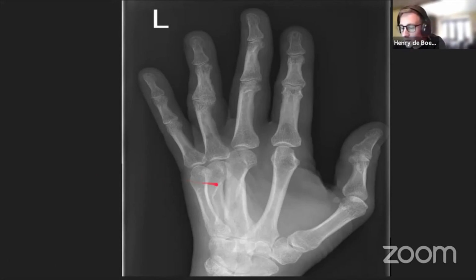Okay, so waiting for a few answers. I'm going to take the slow answers to mean that this is potentially slightly more tricky. Yes, there probably is some mild osteoarthritis of the distal and proximal interphalangeal joints, but you could ignore that.